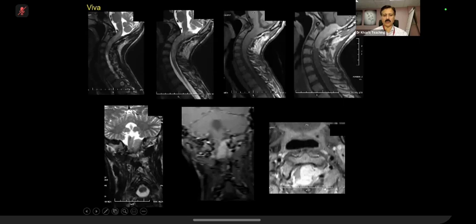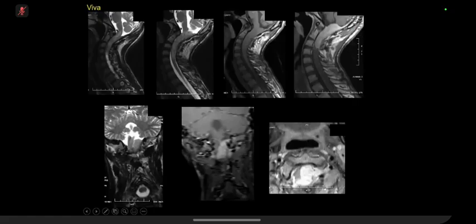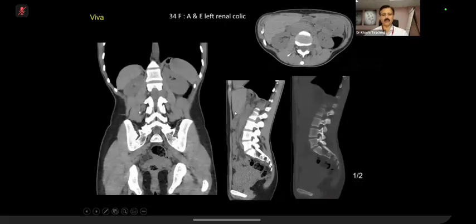There is a bit of a dural tear here. But the key point to remember is, don't jump to conclusions on a sagittal sequence. Is it intramedullary or not? And always ask the examiner, I want to see further.